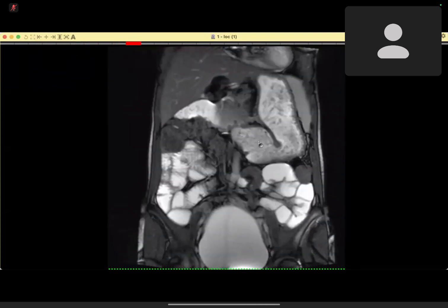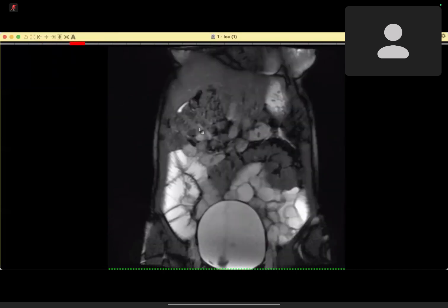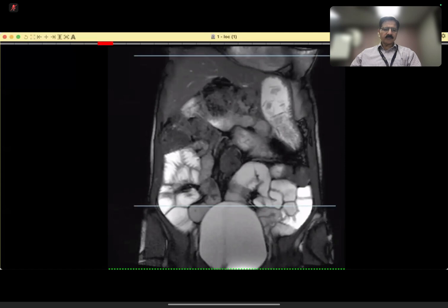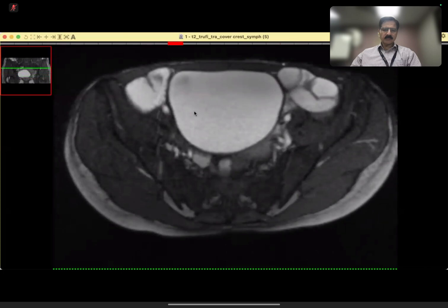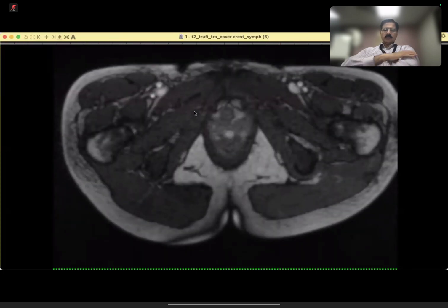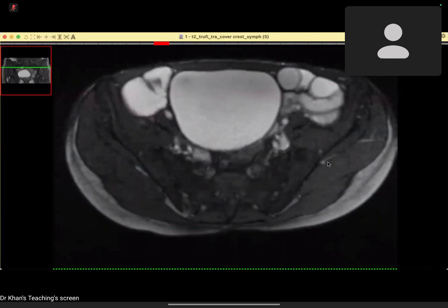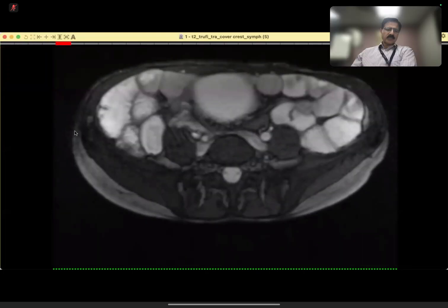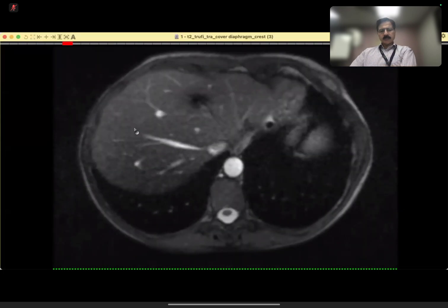I saw that after the stomach there is the duodenum here, and it appears connected to the jejunum over here. And okay, just 1 second, please. Over to you. Okay. So this is the axial T2 images for the same patient. I can also give you the upper abdomen. So this is the upper abdomen. Over to you.